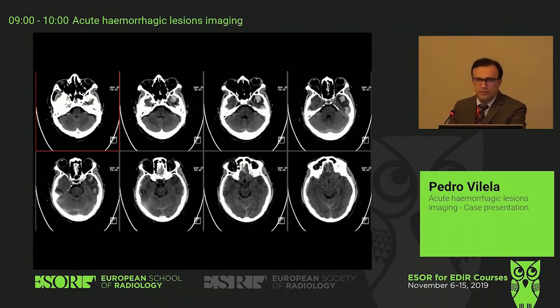This is where we are going to have also the brain lesions from the impact of the gyrus rectus and orbital frontal gyrus into the floor of the anterior fossa. Okay. They are contusions that have hemorrhage and also have edema associated. Okay, so we have seen the compartment of the brain. Do we have other areas of bleeding?